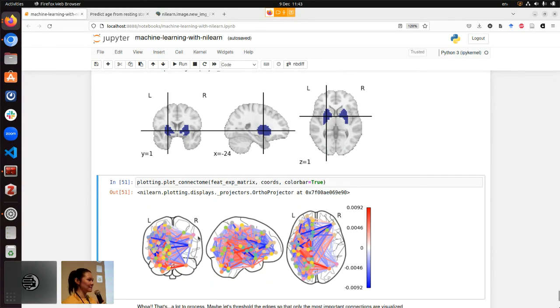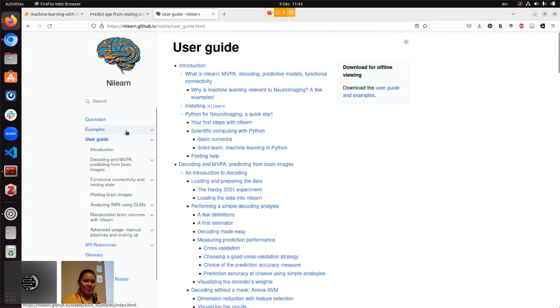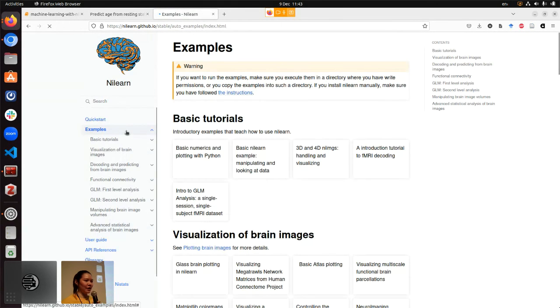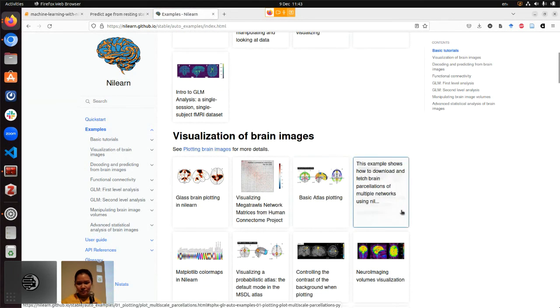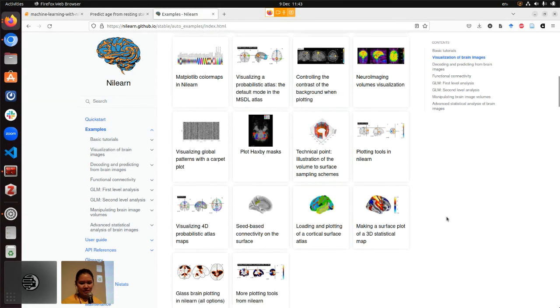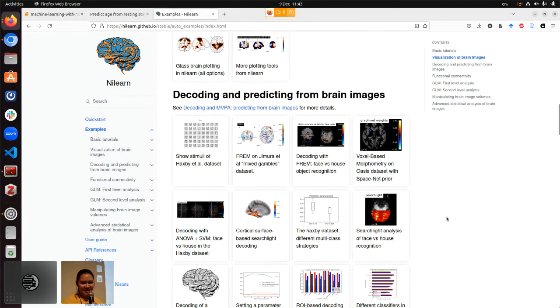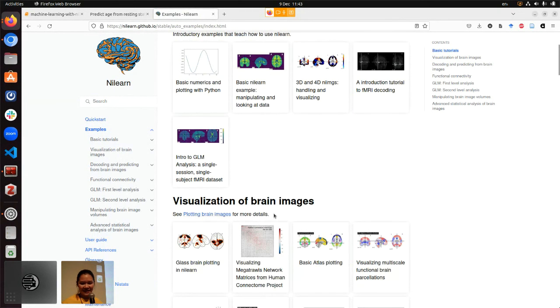Yes. There is a region extraction function somewhere in the library that can separate ROIs from the predicted regions. Yes, we have a fantastic addition from Bertrand. There is a separate ROI function in Nilearn, and I can probably find the relevant tutorial on the Nilearn website. I remember it is separating the atlas.